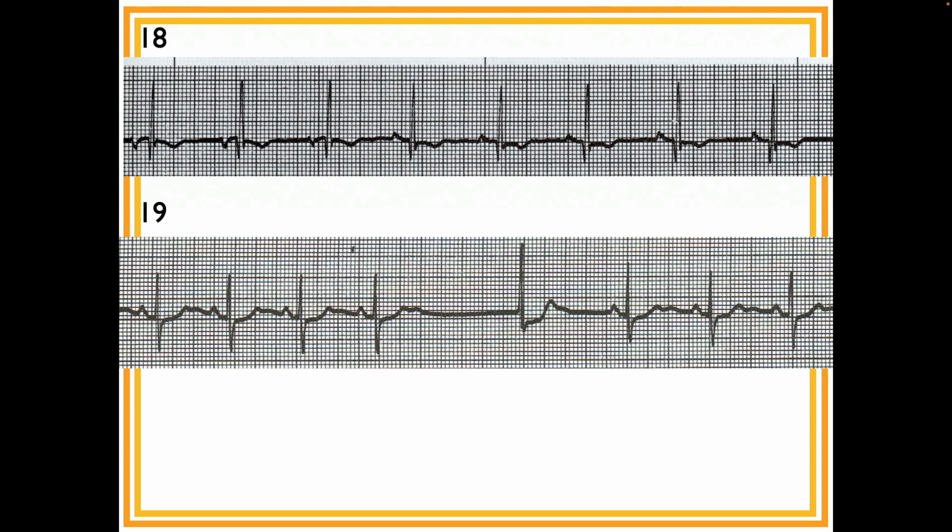Last, but definitely not least, number 19. Alright, so this looks regular besides that sinus pause in the middle.